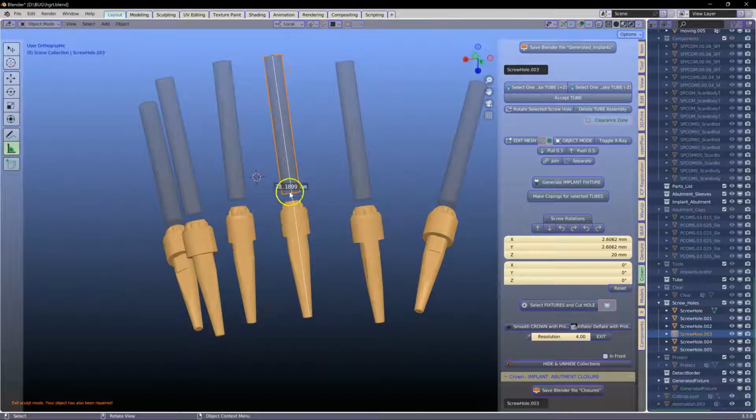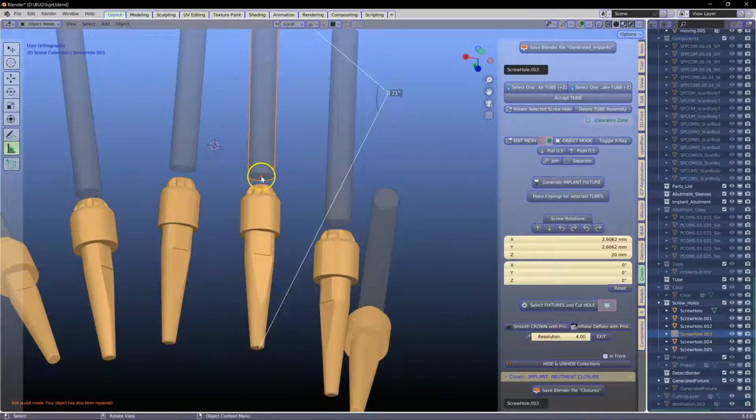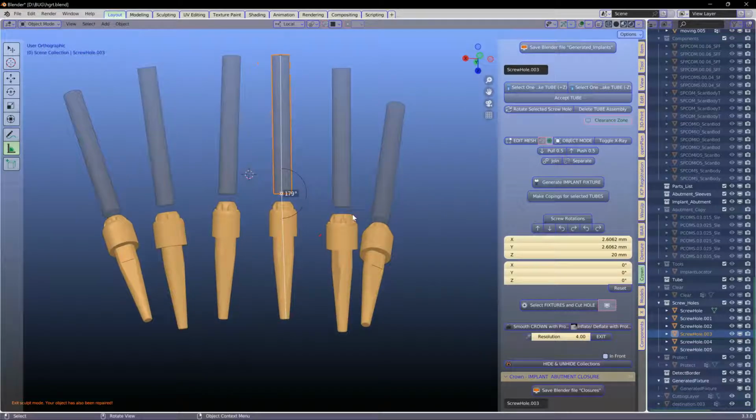Then if we want to measure an angle, all we need to do is left click over here and move this angle like that. Again, I want this to be exactly on that point. So taking it, control and drag it, and it'll snap exactly to where I want it to be. So this is a good indication. This is 180 degrees, which is straight. This being 90 degrees, if you put the angle this way, it would be 90 degrees.